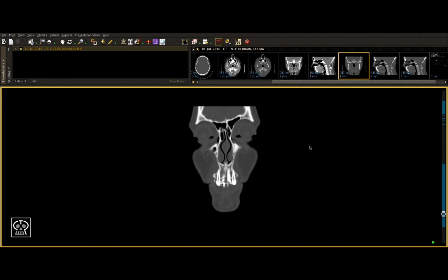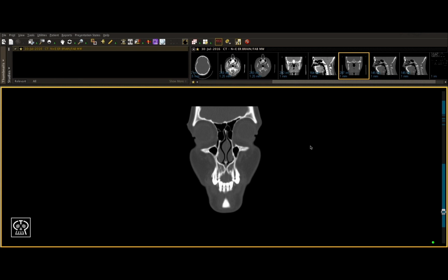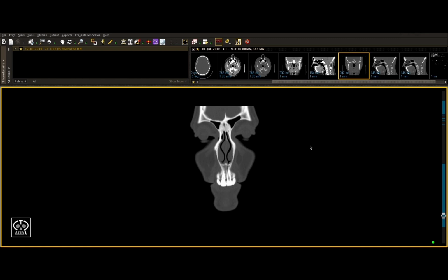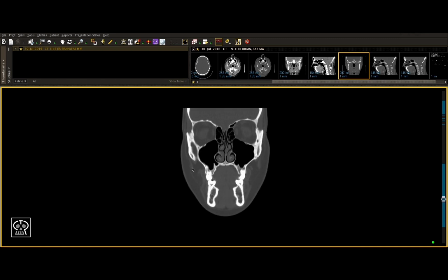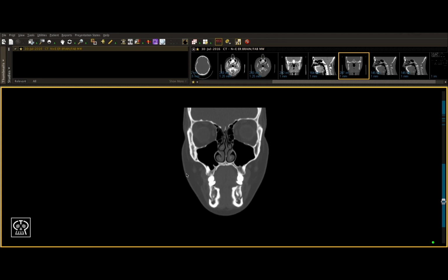Okay, let's jump on a CT scan and I'm going to walk you through those suture lines that we just saw. First, I'm just going to show you them on a coronal view, as it's similar to the picture you saw. And then after that, we're going to go through our approach to ZMC fractures and the steps we're going to take when analyzing the scan. So first off, if you look at your ZMC, you'll see the zygoma. We'll focus on the patient's right side for now.